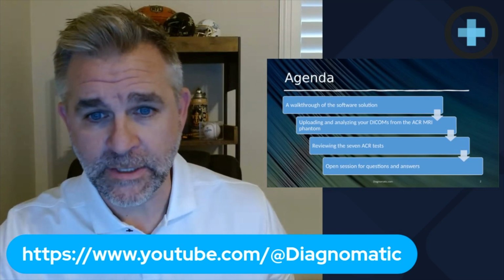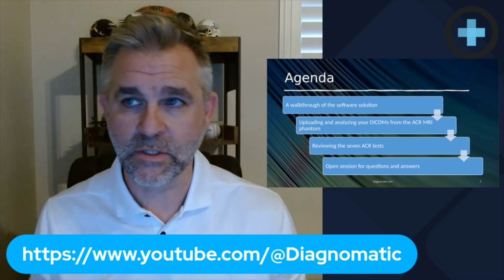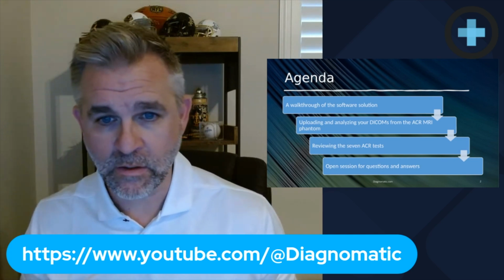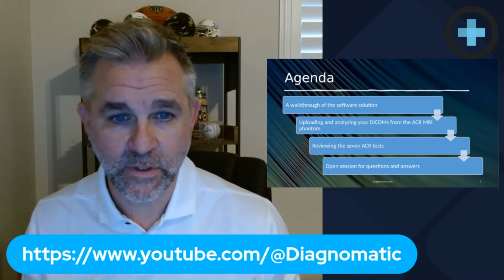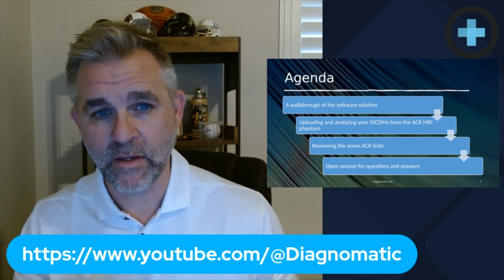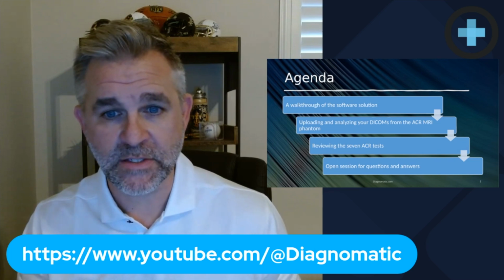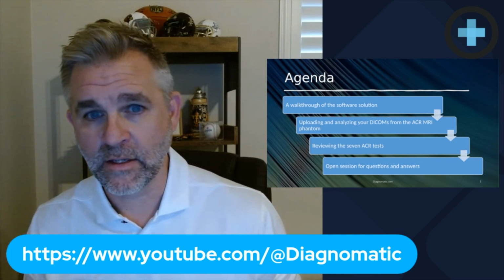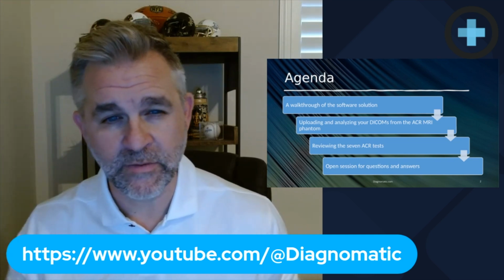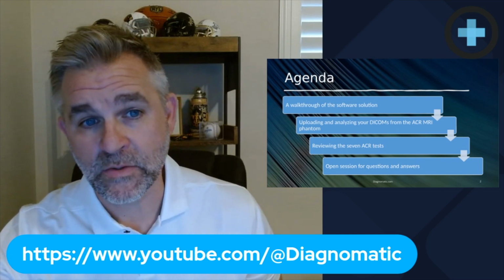So what are we going to be talking about? Like I mentioned, we're just going to do a quick walkthrough of the software solution. Many of you have probably seen the software, used the software, might be familiar with it. So just going to do a quick layout. Next, we're going to show you how you would actually upload the DICOM images you have for the MRI Phantom, show that process. And then we'll go through all the 7 tests that pop up and what ACR is looking for in each of those, and just a little bit of an explanation. And then open it up if anyone has any questions or anything else that would be helpful.